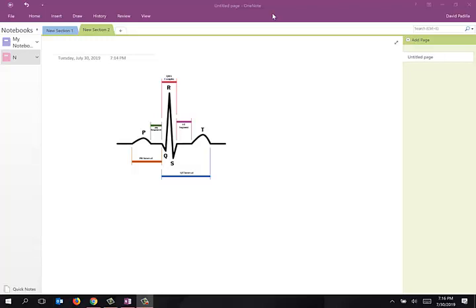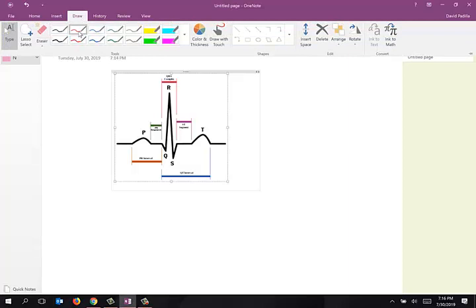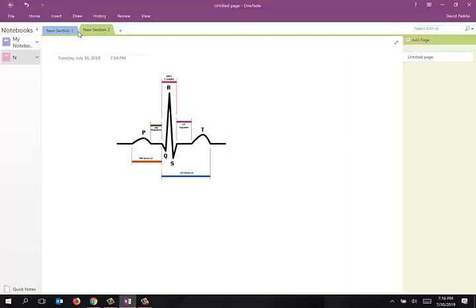This will be one video in a series of videos that are used to help identify EKG anomalies specific to myocardial infarction. All right, so the first thing I want to cover is the basic EKG rhythm. I have here on the screen this real generic QRS complex. And one thing that seems to confuse people right off the bat is what's occurring with each specific area of the EKG.